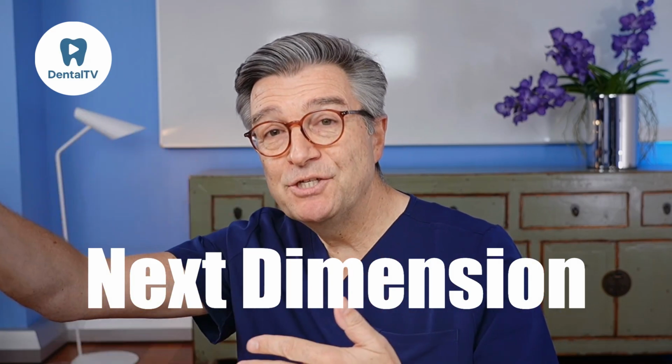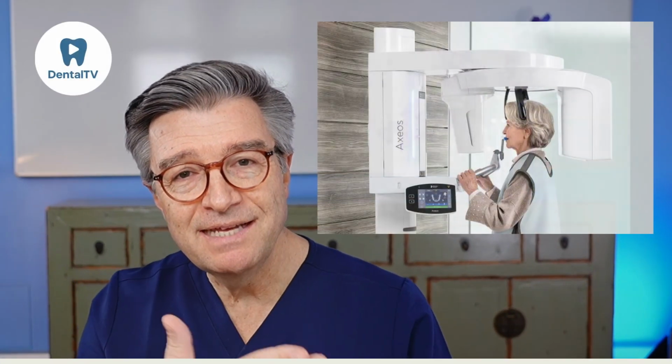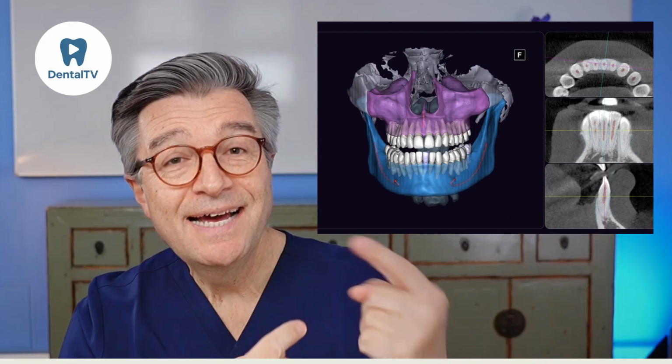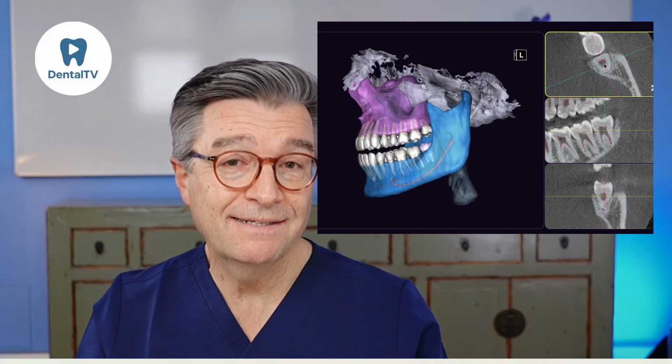In the last episode, we explored 2D radiography and the principles that help you interpret projections with clarity. Today, we step into the next dimension and unlock the foundations of modern 3D diagnostics. CBCT is not simply a better X-ray. It's a fundamentally different way of seeing the patient. Instead of one projection, now we see structures as they truly are: three-dimensional, contextual, and connected.